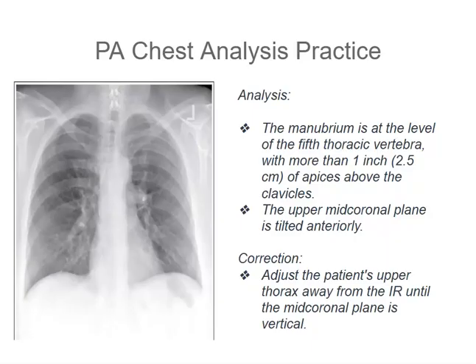Again, I'm going to look at the sternoclavicular ends to determine if there is any rotation. These clavicular ends seem to be symmetric to the vertebral column, so there is no rotation. However, next I'm going to look at the position of the manubrium and the clavicles. The clavicles have a vertical look to them as opposed to the horizontal position we like them in. Also, the manubrium is sitting at a level below the fourth thoracic vertebra. It looks more like the fifth.